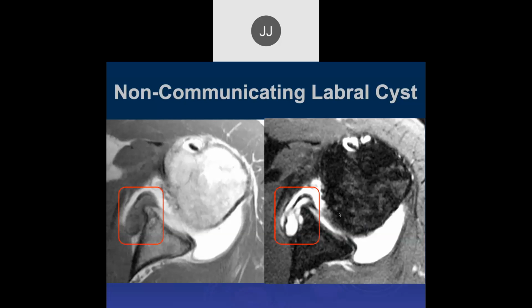Yeah. What do you think, John? Well, we're just used to knowing what these look like now, but you're right. I think it can be confusing, which is the reason I included this case so that the fellows would see it. You're right. Okay.